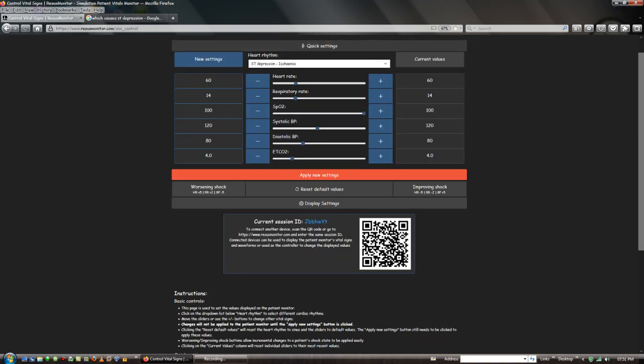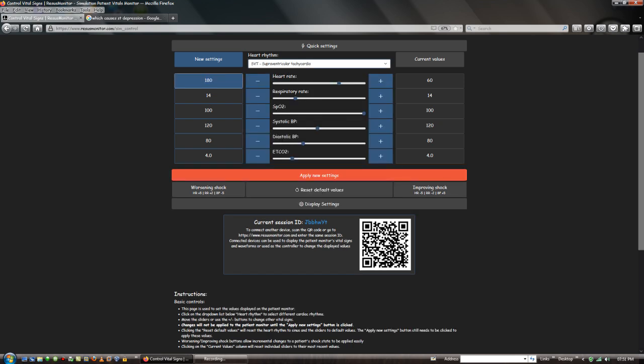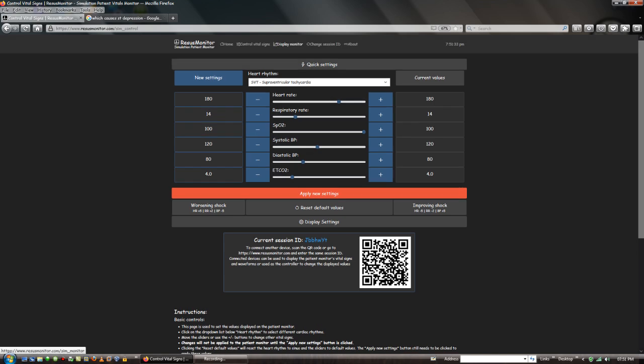We're moving to the next heart rhythm, SVT, supraventricular tachycardia.